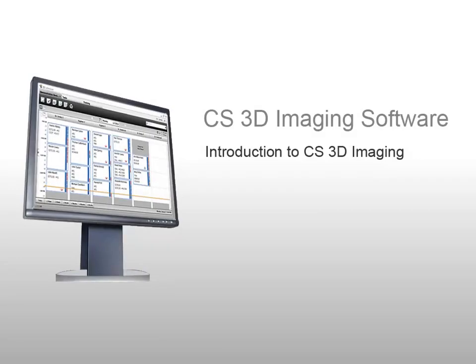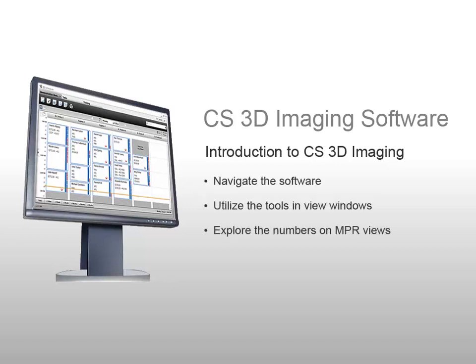CS 3D Imaging: Introduction to CS 3D Imaging Recorded Class. This recorded class is designed for all team members and provides an introduction to the CS 3D imaging software. By the end of this class, you should be able to navigate the software, utilize tools in the view windows, explore the numbers on the MPR views, and manage adjustments.